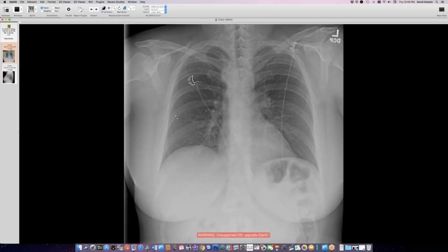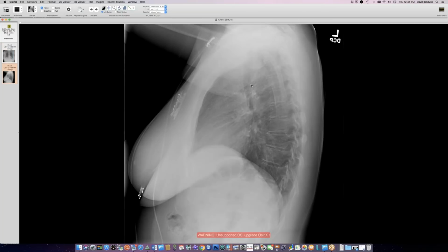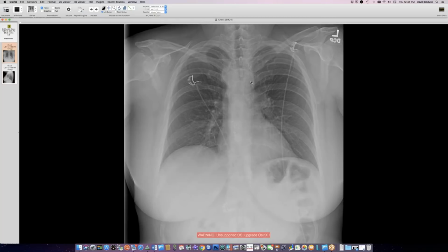And it's bigger than the implanted loop recorders that I've seen, but I don't know if anybody else has seen a loop recorder that looks like this, but I don't know whether she had some pre-existing cardiac condition that required monitoring. But I was entranced with her mediastinal mass here and her tracheal deviation. And I looked on the lateral view to see if this was a right aortic arch with aberrant subclavian, hoping for an impression on the back of the trachea, and maybe there's a tiny little impression here, but not enough to make me think of that.